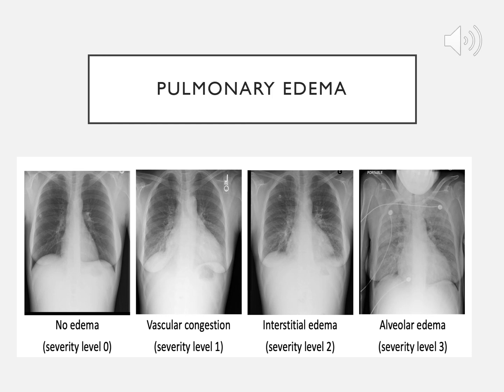Really, vascular congestion, you'll see that a lot. If you read a radiologist's interpretation, they'll say increased vascular congestion, suspect congestive heart failure, or something like that. But again, we're really wanting to be able to look at these X-rays, know what's normal, know what's abnormal, and at least know what that abnormal is. It looks like vascular congestion.